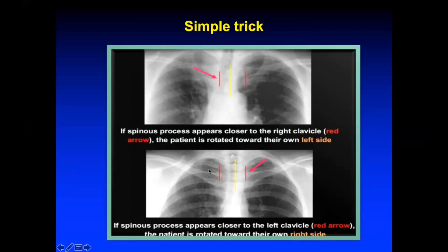So this is the easiest way out. Even if in exams you are asked to describe, or we are given an X-ray and asked which side the rotation is on, just follow this easier principle. You will never be confused about the rotation side. So always, the greater the distance, the rotation is towards the same side. That is very important.